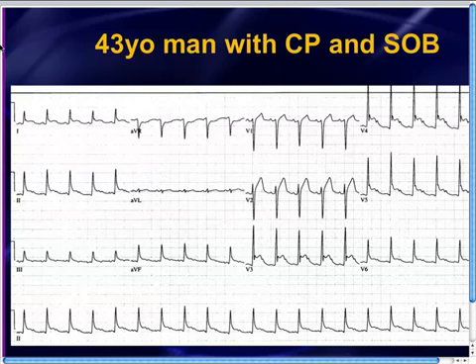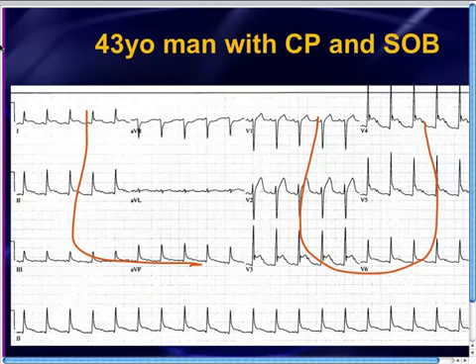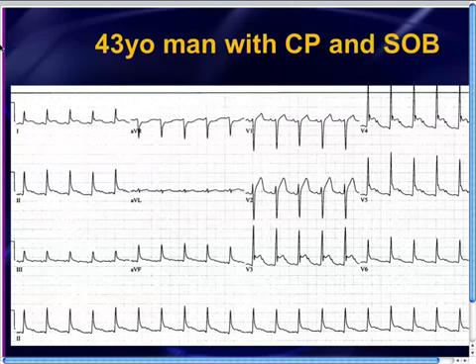past couple of weeks. The main reason to present this case is to focus on ST segment elevation. And you'll notice that there's a whole heck of a lot of ST segment elevation. There's ST elevation in the limb leads. There's ST segment elevation in the precordial leads as well. So a lot of ST segment elevation.